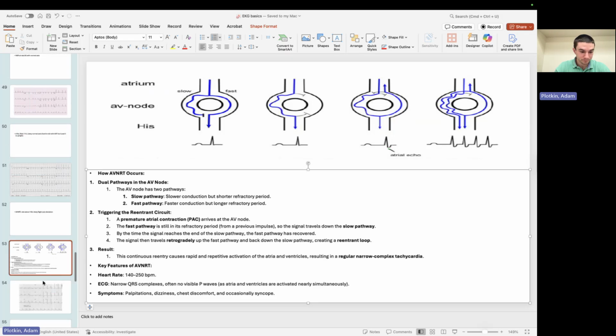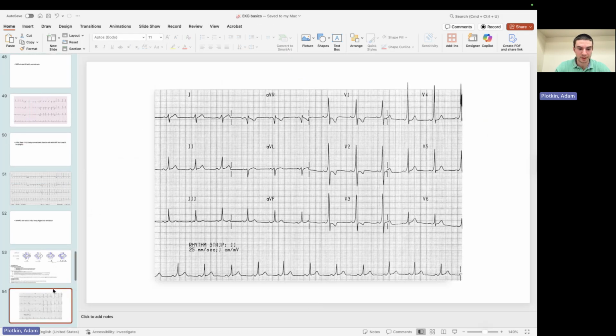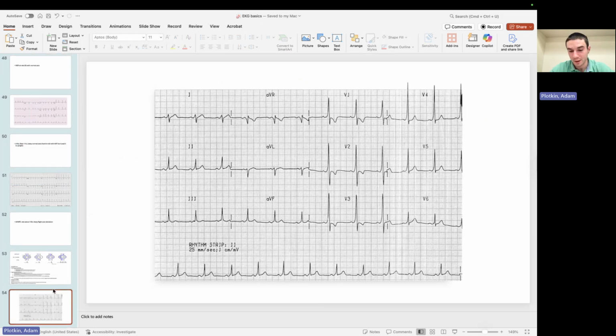All right. And then so what do you see on this one? What's abnormal here? So pause your screen and tell me what's going on.